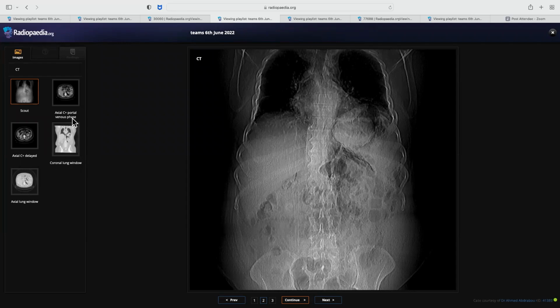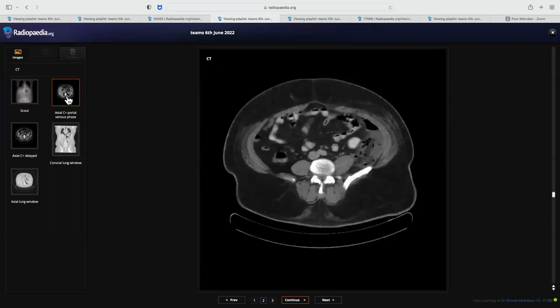We don't know that they have the rest of the images with them. So here you saw the rest, and you said, can I see the rest? Otherwise, when you just see this X-ray, you would immediately say that this is an emergency. First of all, you will tell that this is an emergency. I would urgently convey my findings to the surgeon, and then you would talk about CT. When we see the CT, it was very obvious, you told.